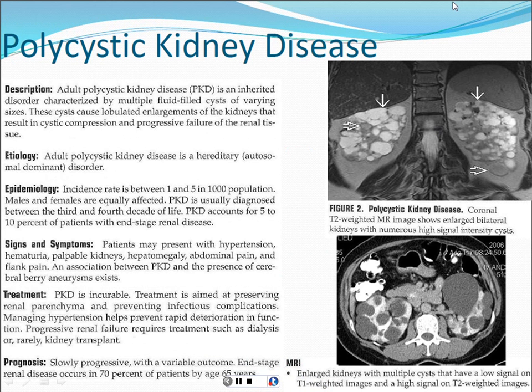So this is an example of polycystic kidney disease. You can see just a bunch of cysts, and they're almost in the shape of a kidney. You can imagine this used to be what a normal kidney would look like. This is a T2 weighted image, so most of them are bright on T2, just like fluid should be. But you also see ones that have a little bit intermediate signal intensity. They can sometimes have some proteinaceous content that will change their signal characteristics.